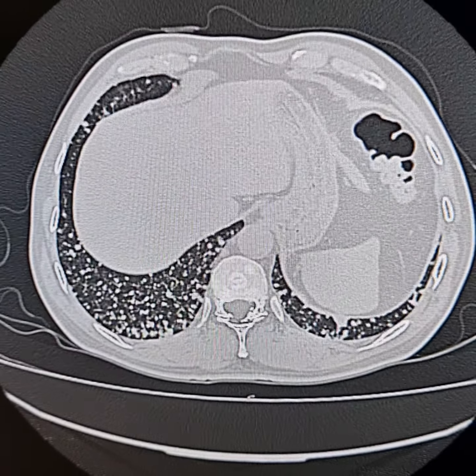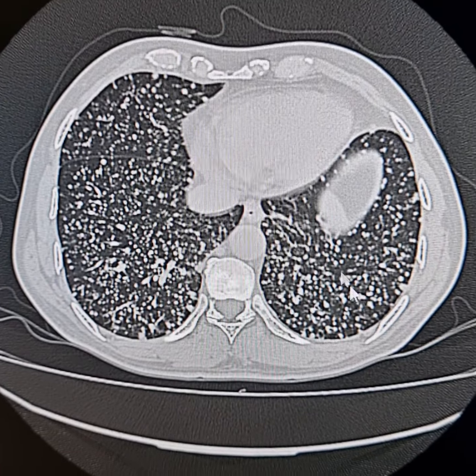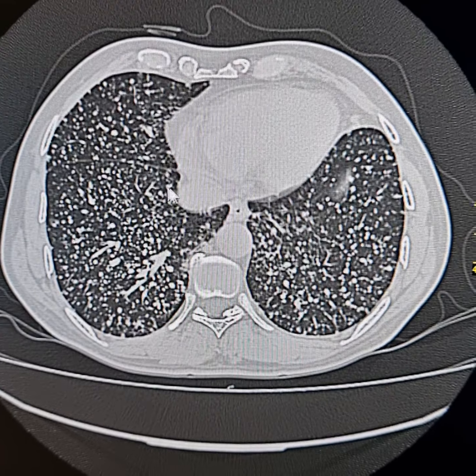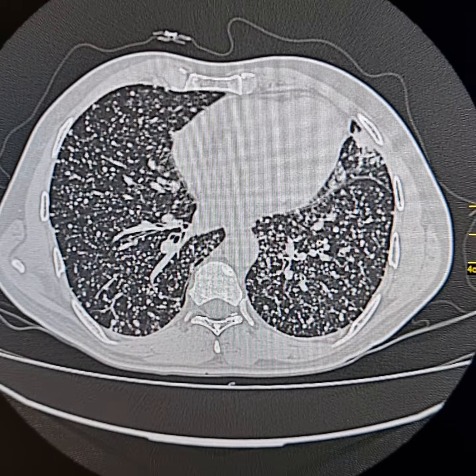These are typical of miliary carcinosis. Now, please observe that these are also oriented along the pleural surfaces and at places along the bronchovascular bundles.